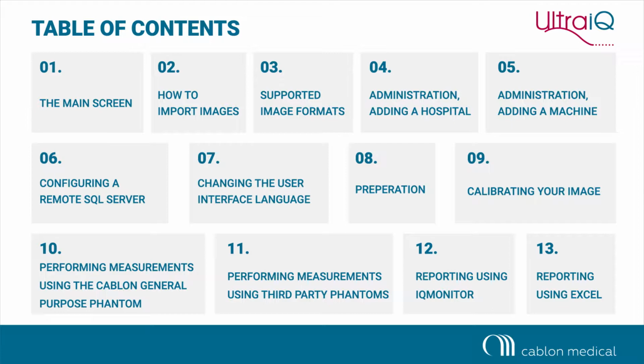a machine, configuring a remote SQL server, changing the user interface language, preparation, calibrating an image, performing measurements using the Cablon general purpose phantom, performing measurements using third-party phantoms, reporting using IQ Monitor, reporting using Excel.